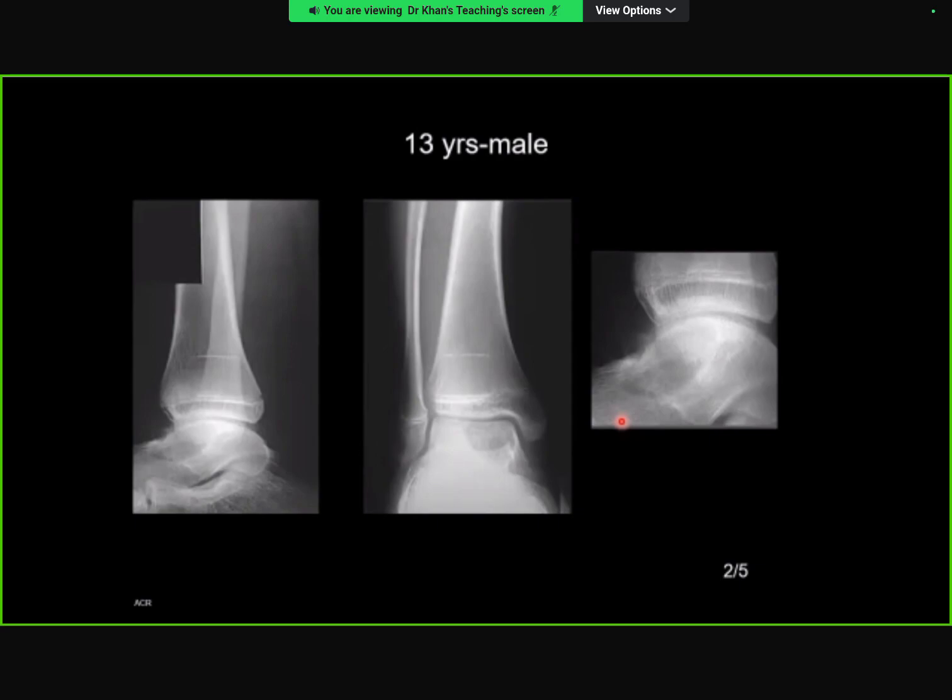this is most likely an epiphyseal kind of lesion, a single lucent lesion. So the ABC is arising from that pre-existing lytic lesion in the dome of the talus. I'm struggling to find out what this primary lesion in the dome of the talus could be, and then from there the ABC is arising. Okay, that's fine. I'll take over. It's because of the benign appearance, because of the narrow zone of transition.